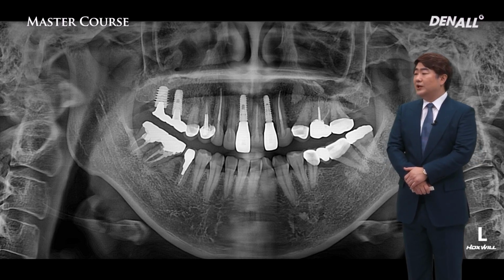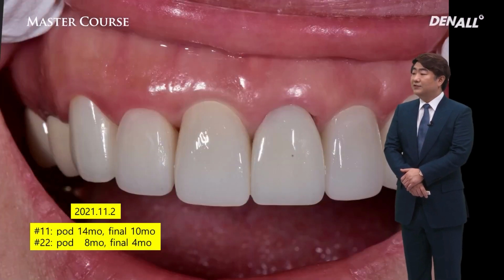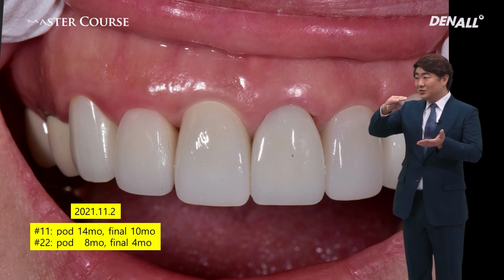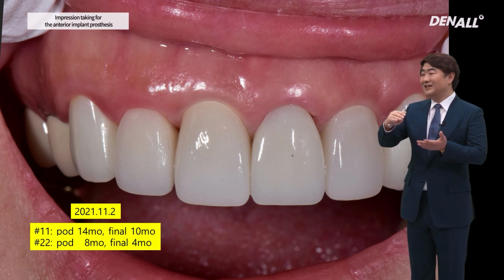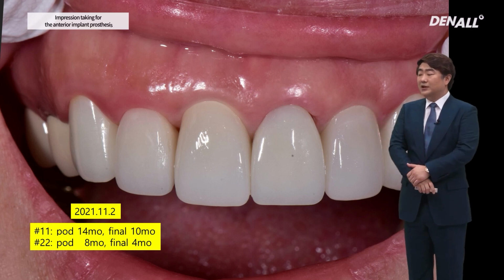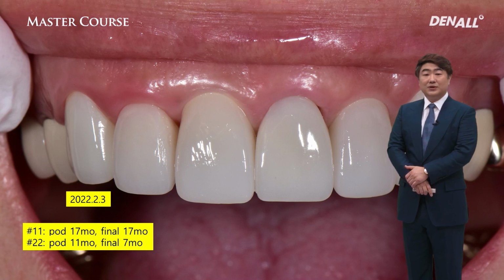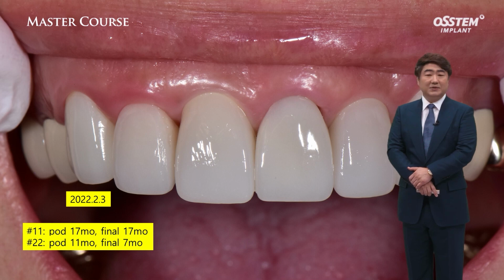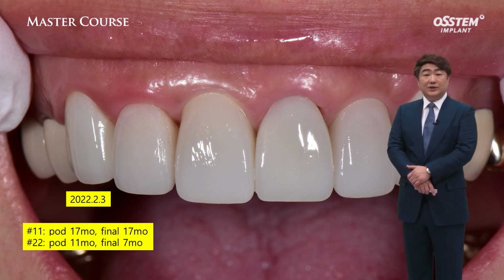A few months later, this is from June, then again 5 months had passed, and we took this photo. In number 11, there's a bit of stabilization, and in number 22, the margin level is not really clear. In a more recent photo, number 11 seems by now to have a margin level the same as the adjacent teeth, but number 22 seems to have stabilized after the collapse.